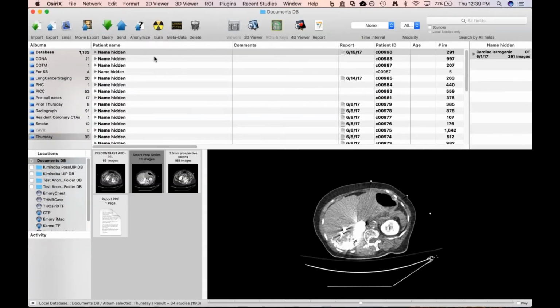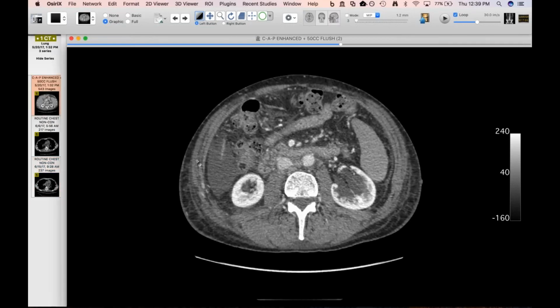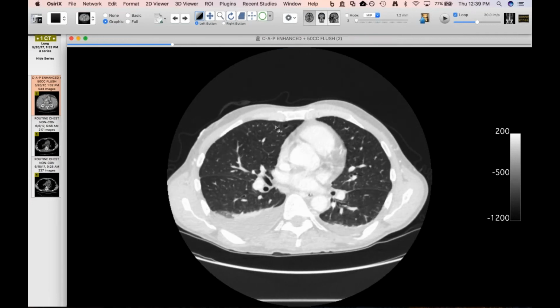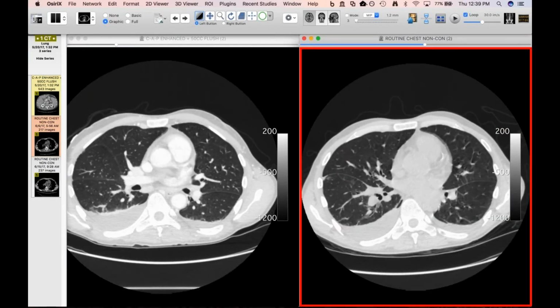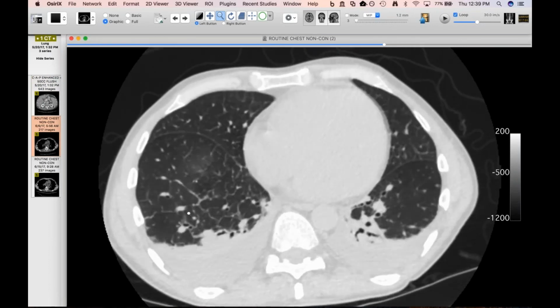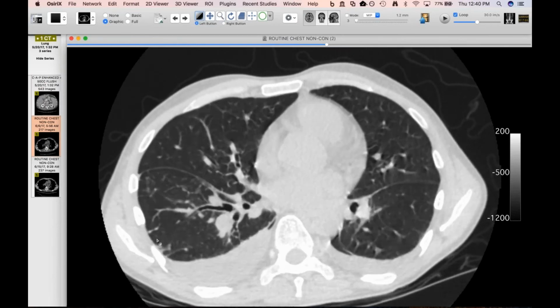And I want to show one more quickie, and this is for Howard. I just saw this morning, and I'll go through it briefly. This is a guy with leukemia of sorts. Here he is last month on the 20th, and not too exciting. He's got small effusions. Then he comes back a couple weeks later, and you can see he's got some septal thickening, which is predominantly smooth. The effusions are still there, but in addition, you see a couple of little peculiar nodules here.